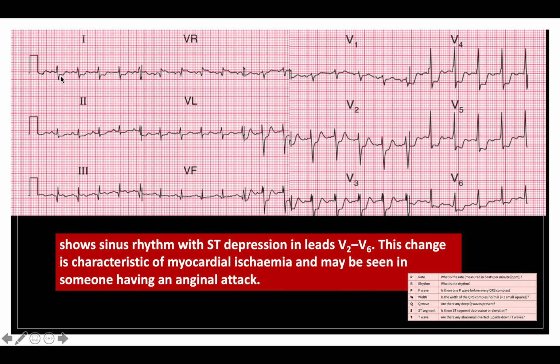When you scan for it in lead 1, no. Lead 2, no. Lead 3? In lead 3, is there meant to be a Q, or what about the S wave? Remember when we spoke about lead 3 coming from the left arm to the left leg, going from negative to positive. So it was following the same direction as the heart, and it should look almost similar to lead 2. Here you can see there is a greater deflection in the Q wave in lead 3, which should not be the case. So it's safe to say there is some sort of pathological Q wave, but at the same time there isn't. When we speak about normal variants tomorrow, you'll learn more about it.